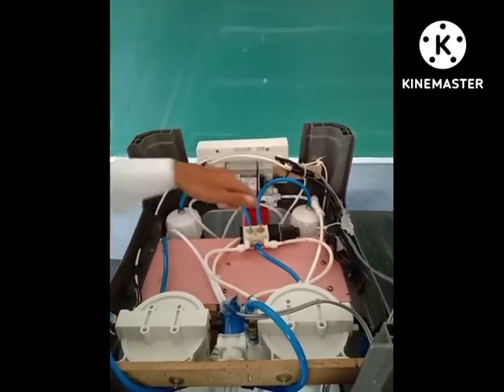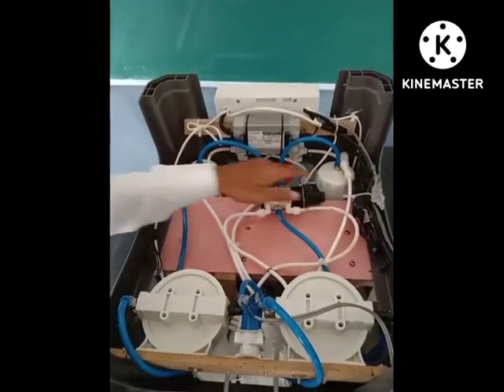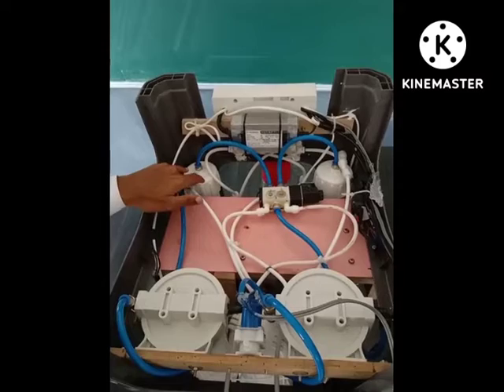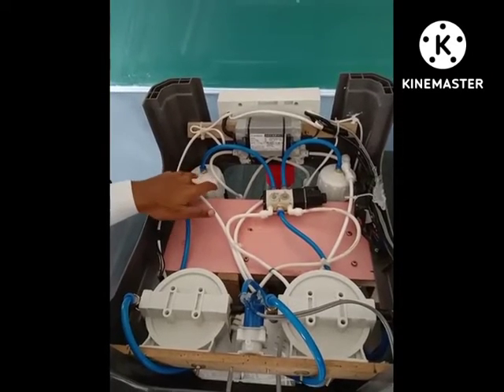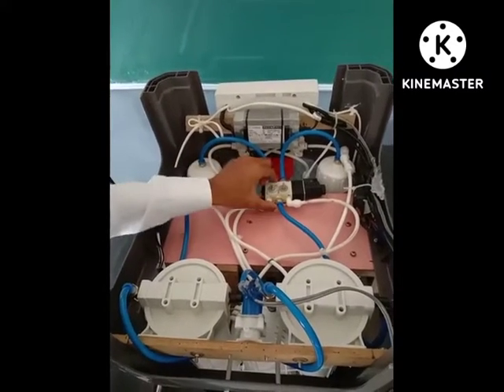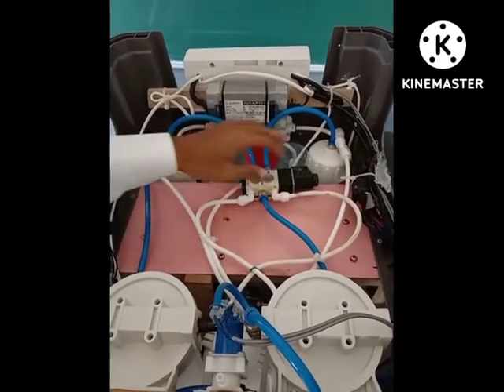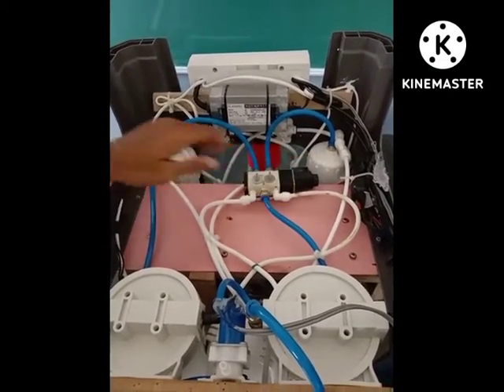These two tanks are the zeolitic tanks where the zeolite granules are present, and they are used to purify the air; the zeolite traps nitrogen particles in these tanks. This is a 5x2 direct acting valve. This valve is used to switch the cycles between zeolitic container 1 and 2.